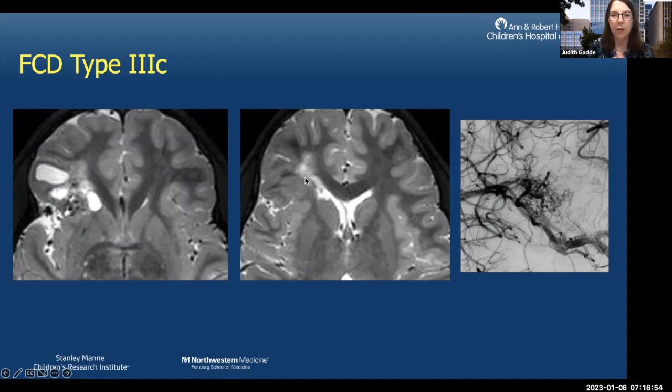And I would try to think of how to say this, but I would not think negatively of anyone who would just call this cystic encephalomalacia gliosis, because honestly, that's probably what I would have done if I wouldn't have known otherwise. But just try to remember that focal cortical dysplasia can show up as this subtle T2 hyperintensity associated with other findings. So just something to keep in mind.